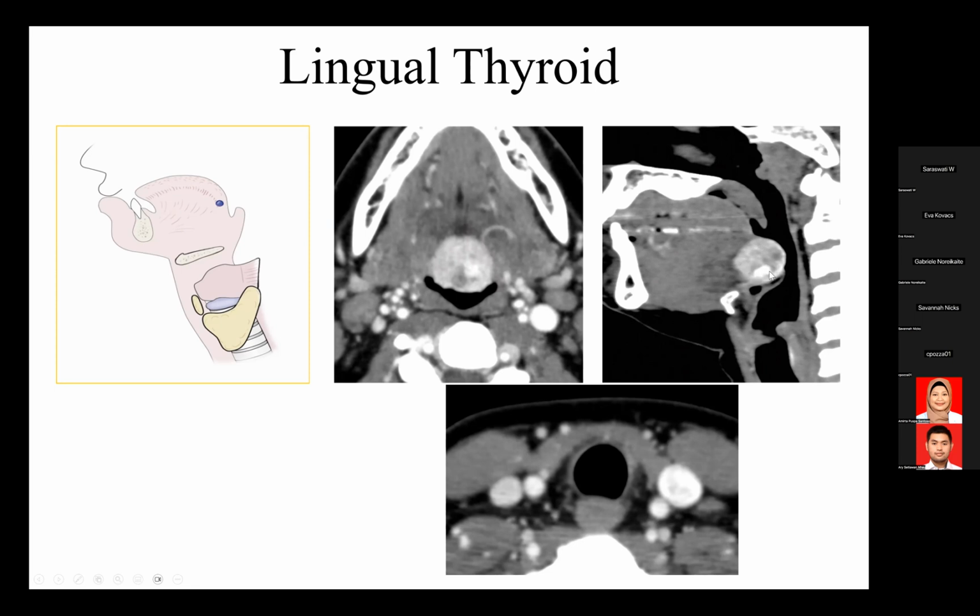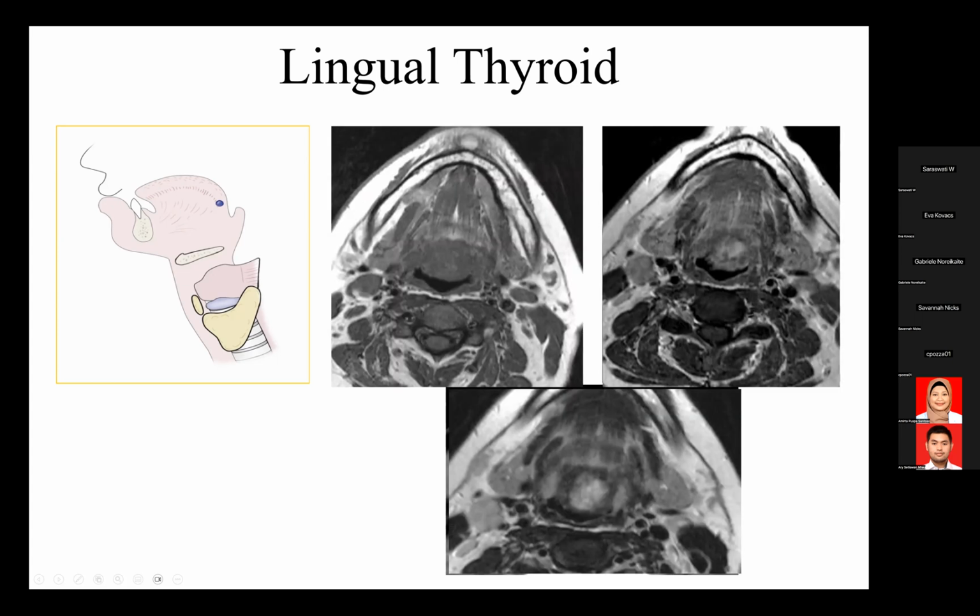This actually has a little bit of calcification in it. And then when we continue our CT scan to the anterior neck, notice how there's no thyroid gland in the expected location. So this is an example of that lingual thyroid gland that's purely located within the foramen cecum.